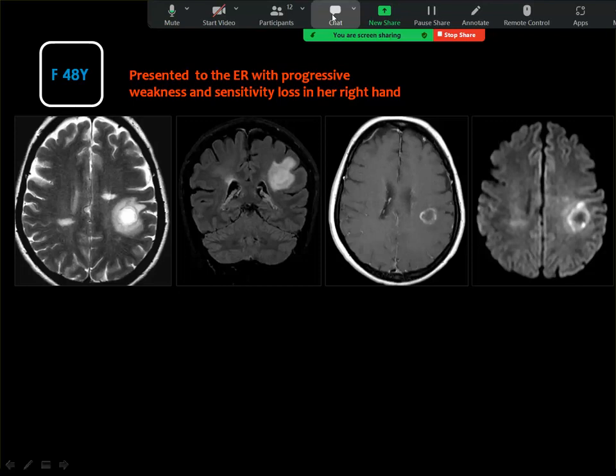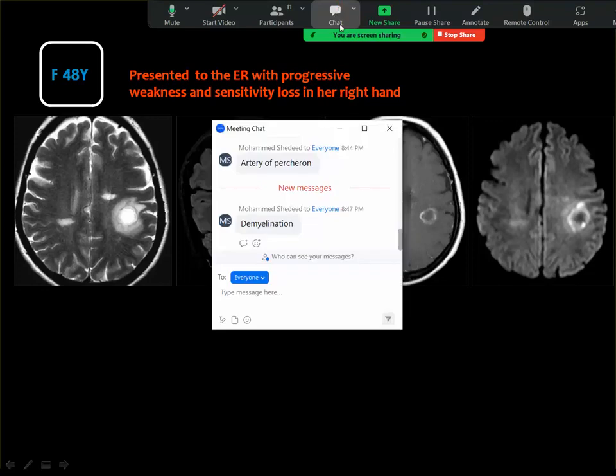This lesion is now, I don't know why, frequently seen in clinical practice, but it is sometimes misdiagnosed. Then I wanted you to see it.